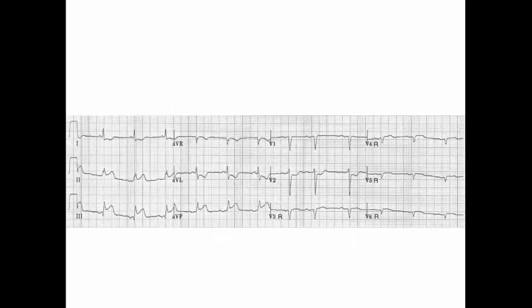Here, let's see this patient who was having right ECG leads in order to exclude RV infarction. As we can see here, this patient is having ST elevation in V4, 5, and 6 right ECG leads. So this is a sign of RV infarction together with the inferior STEMI.